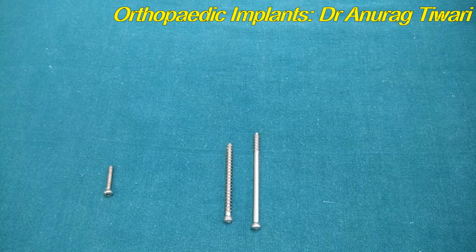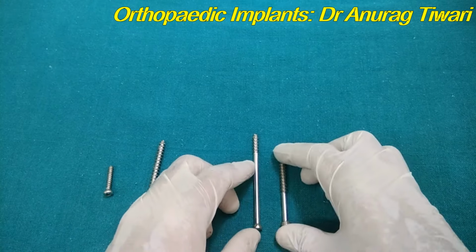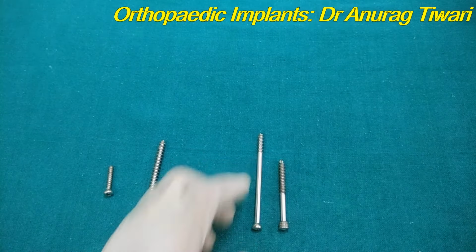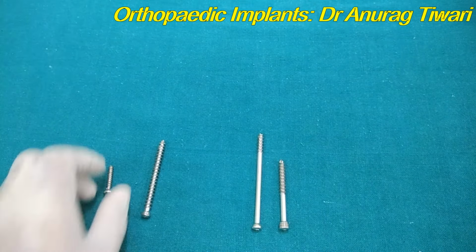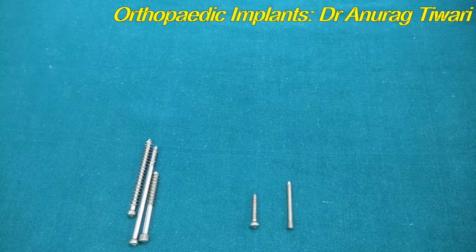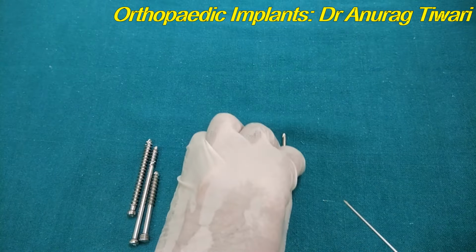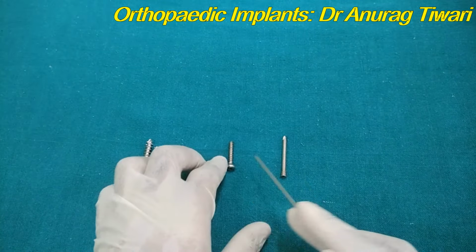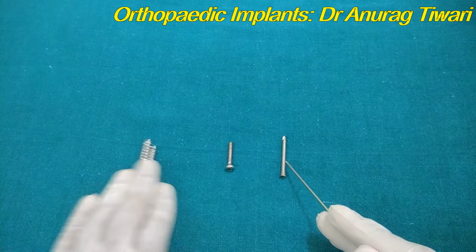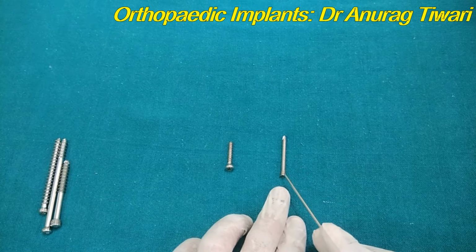Another classification is the simple screw and the locking screw. If you see carefully, just compare these two. This one is a simple screw and this is a locking screw. I will show you why it is known as simple and why this is locking, because the locking screw has threads over the head also.